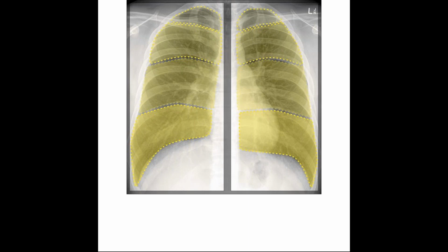Okay. Then other things that you have to see apart from the breathing is the vasculature. If you go about the vasculature, you will see these markings. Like if you see this X-ray, these are basically bronchial vessels or pulmonary vessels which are there.